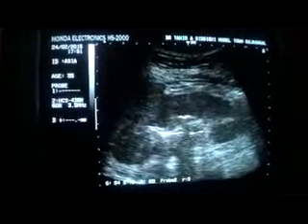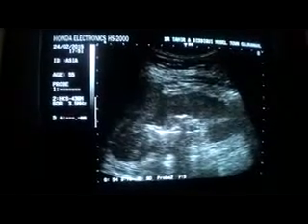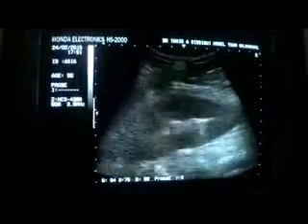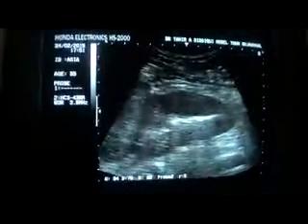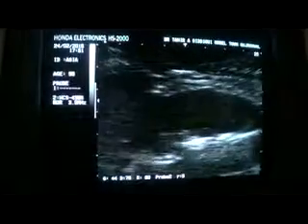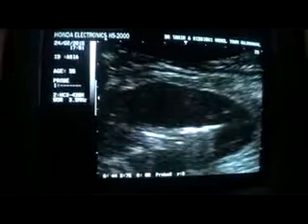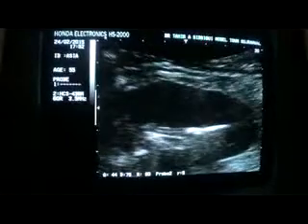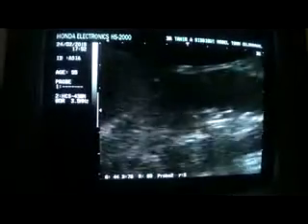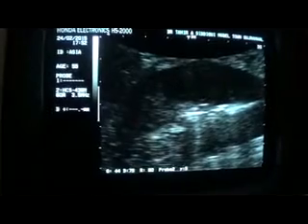So this is a dirty shadow. See, the typical dirty shadow that we see in bowels is seen in this region. Muffled central sinus echo complex, all in the collecting system. Very much typical. Rarely we come across such a case. This is a magnified view to show you the shadows in particular. Now you see this is a typical ring down artifact. This one.